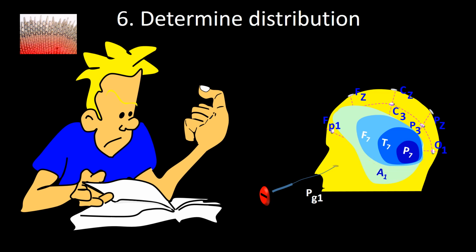At times, the field not only extends forward but also extends towards the earlobe. This activity can be rather significant in its spread to the earlobe and almost have the same strength as the posterior temporal region.